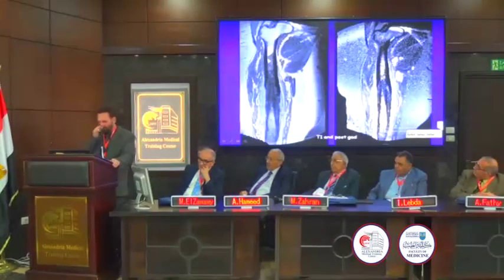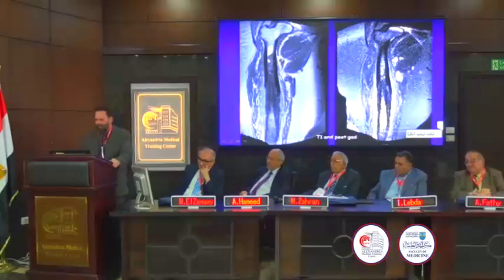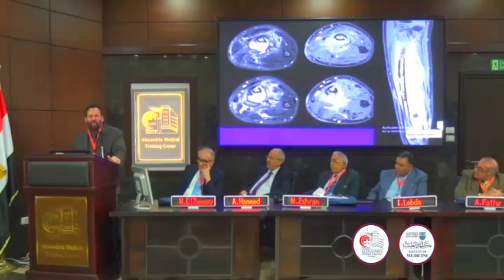Chronic osteomyelitis. They all begin to look the same. Chronic osteomyelitis. Now the signs we look for are a sinus tract, a cloaca, an involucrum, and a sequestrum.